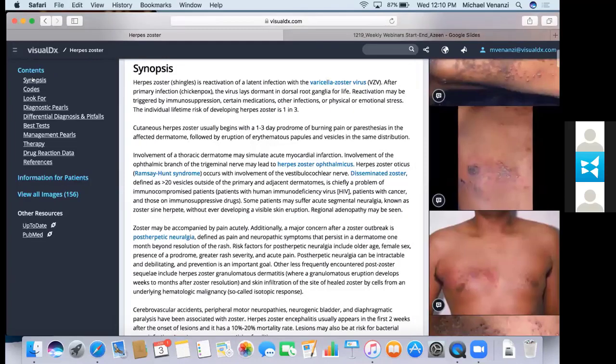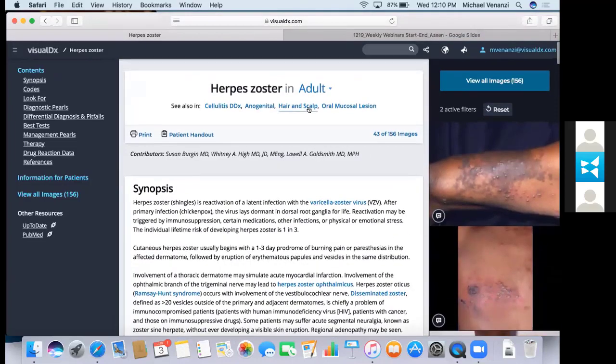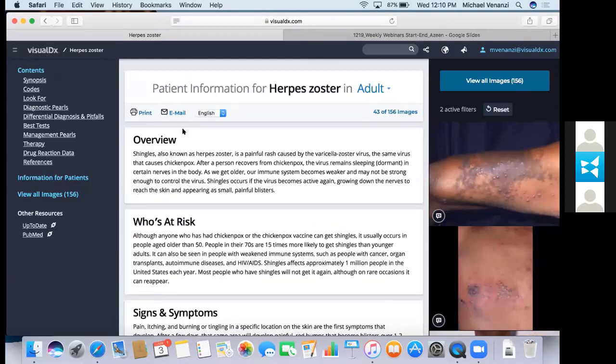And then one final note on each page, we've got more of a common diagnoses that are out there. We've got a great patient handout section as well. This is written in a middle school to high school reading level, a nice time saver for a lot of clinicians if they're looking for an easy way to pass along information surrounding the diagnosis that's just been made. You can easily print this off. You can email to them. It's also written in Spanish and in English.